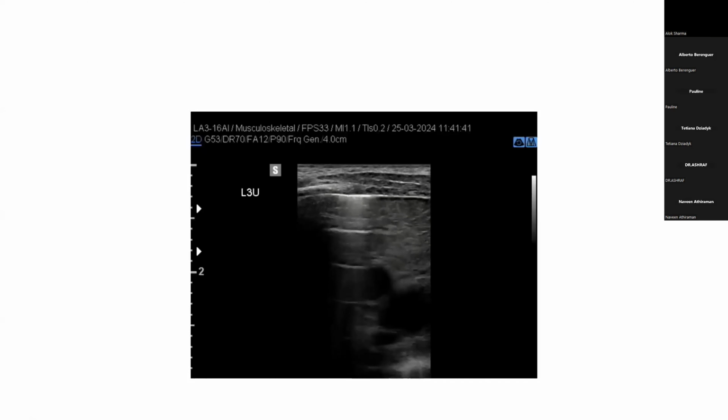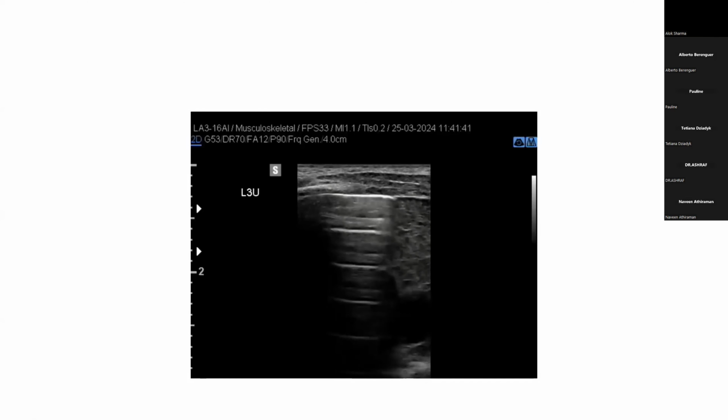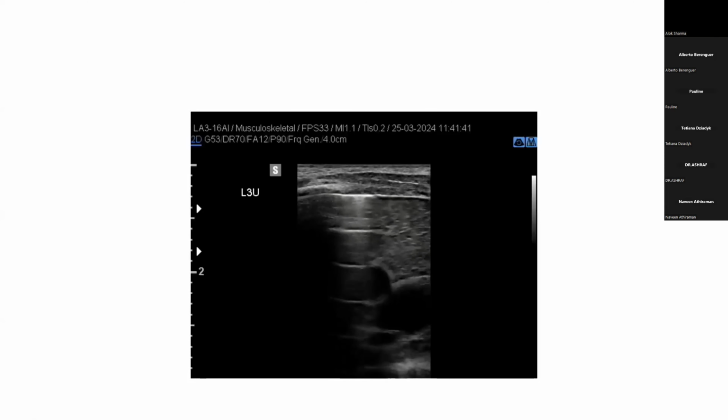What you might have at that particular point, it doesn't give you a bowel-like appearance, but it may be that you've got an organ there of some kind. Was the liver up on the left side? No, maybe only the spleen, I don't know.